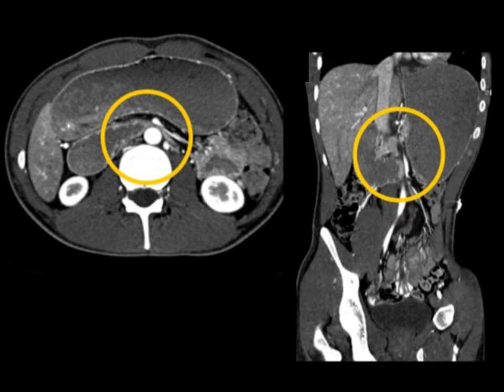Now, in my experience, we do not uncommonly see patients occasionally with a narrowed SMA angle. But just having a narrow angle does not mean you have SMA syndrome. You need to have a narrow angle to get SMA syndrome. But for me to call SMA syndrome on a CT scan, I need to see duodenal obstruction. And so if I see a narrow angle, I'll describe it, but then I will say patients with SMA obstruction also have duodenal involvement. If the duodenum is not obstructed, to me, it's not SMA syndrome.